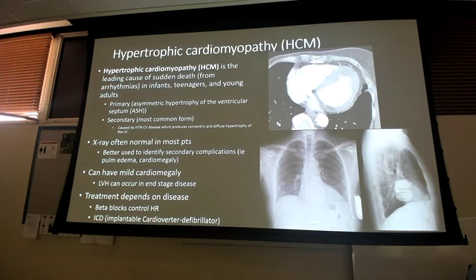So don't get so hung up on the left and right for the chest. It does not make a difference. It will always be left regardless of which way that picture is flipped.